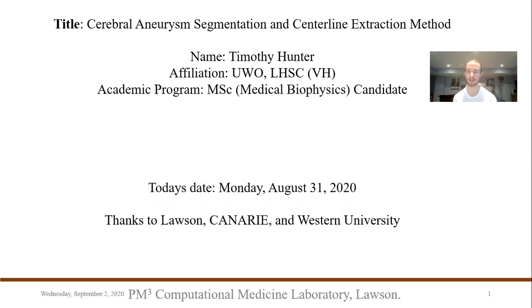This is going to be an instructional video on segmentation and centerline extraction of blood vessels. And I developed this method specifically for cerebral aneurysms.